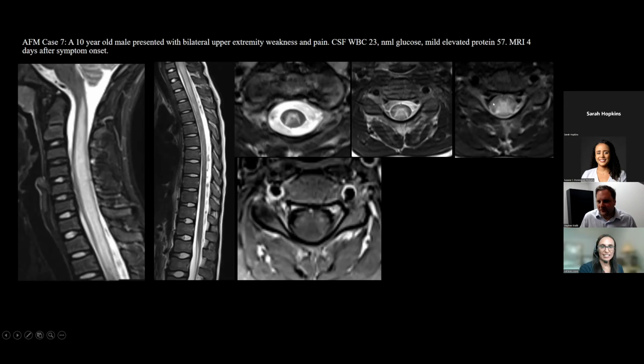You're seeing now it's kind of vague. Is it gray matter predominant? Is it white matter predominant? This is one of those cases we often see, that pluot type case I'm telling you about, where at a lot of the levels it looks good for AFM. Then you start getting here and you're like, is this AFM? Not really sure. This one we felt was AFM.